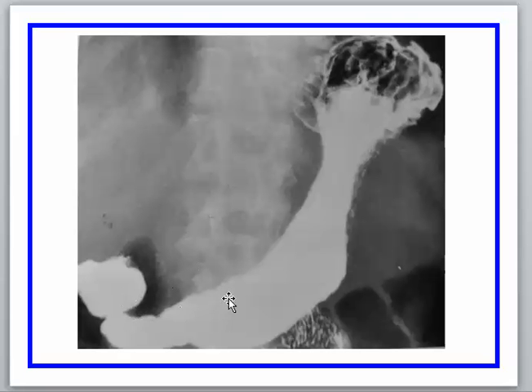You know that carcinoma in the stomach could be creeping along the wall, could be a cauliflower mass inside the lumen, or could be annular at the region of the pylorus usually. So we have three types. This is one type, the creeping type of carcinoma, which we can see, reducing gastric distensibility, or what is called Linitis Plastica.